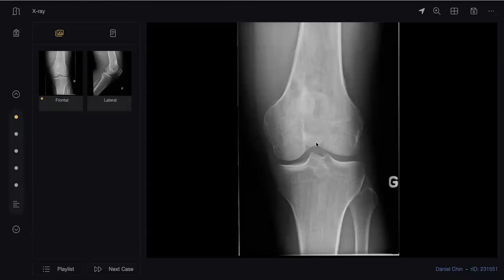What are you forgetting here? What else should you comment on? If you get the same X-ray in an orthogonal view, and other joint involvement that you have not mentioned.